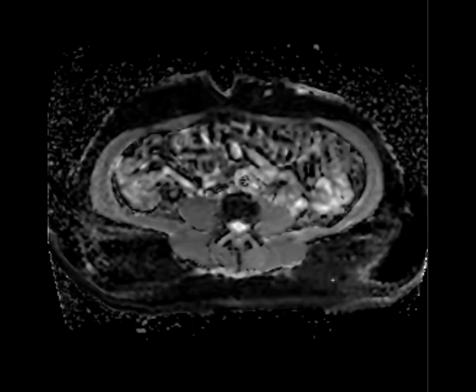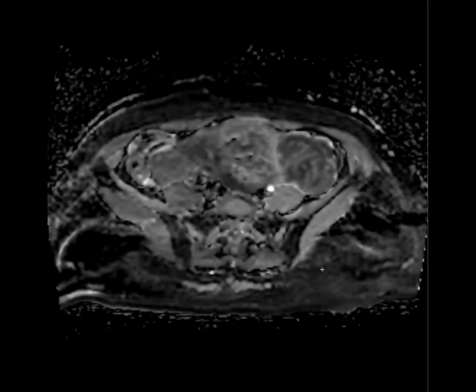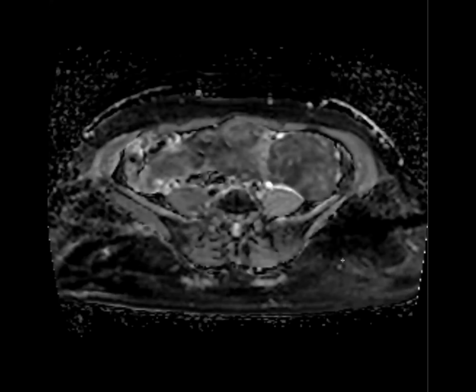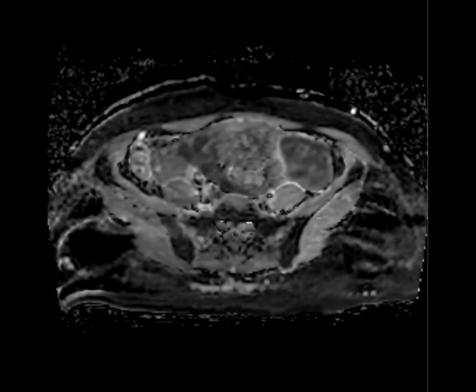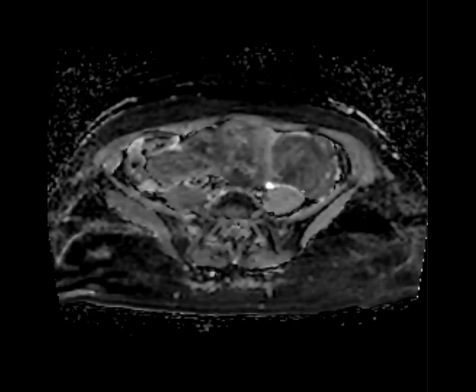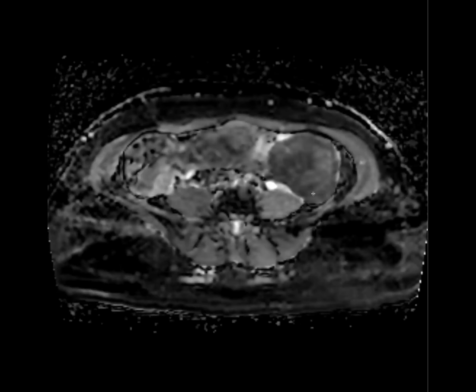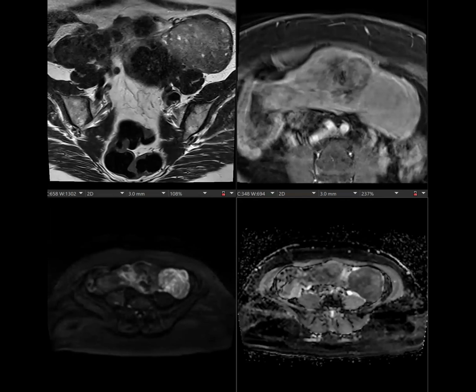So ADC is here. And some of these areas I got it to be pretty low. Below, I think, was it 950 or 900 cutoff? 900, yeah, 900, I think, right? Some of these areas I got it down to like 8 something right there. Okay. And I can pause and show the ROI to prove it to you. But what do you guys think in the meantime?